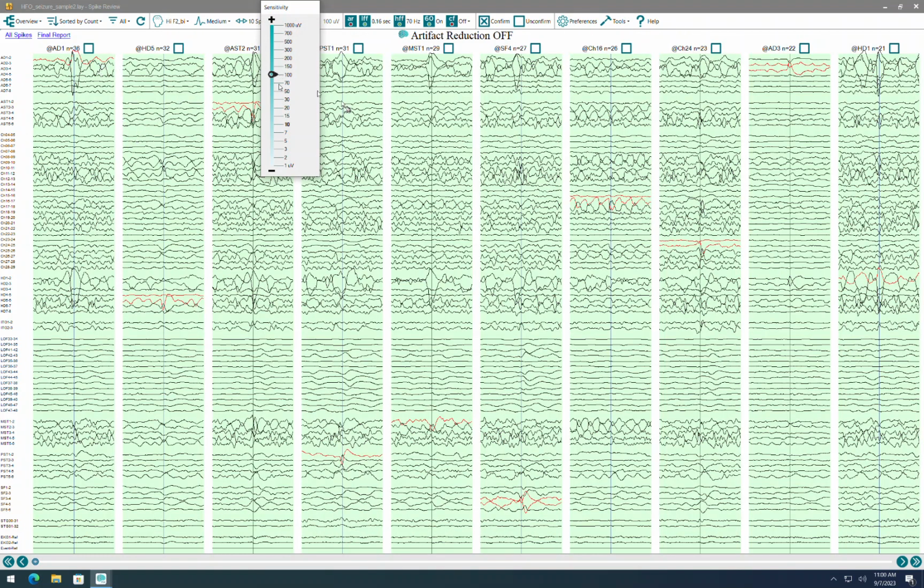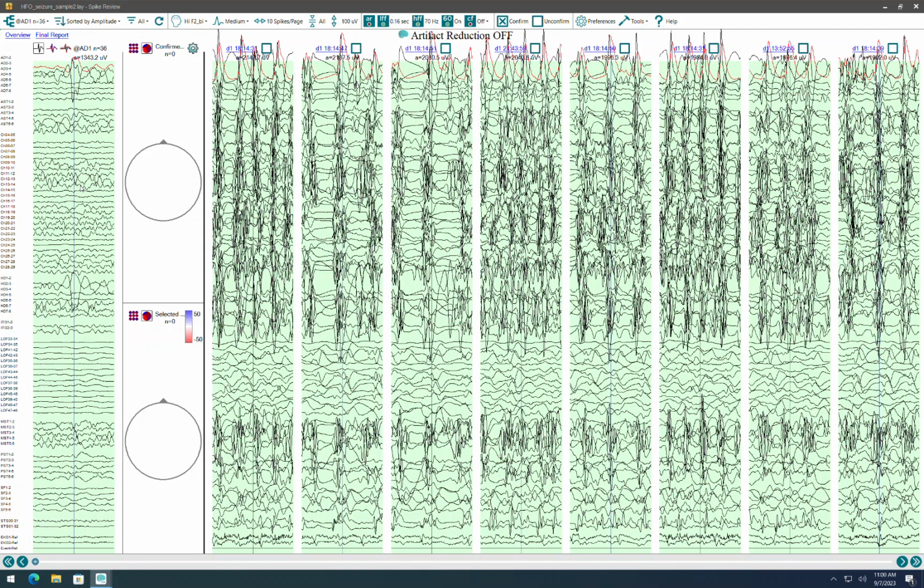And now we're showing, in whatever montage we want to show, the detections by electrode, which is whichever electrode had the highest probability, which tends to be amplitude related mostly, but not always. And each one of these is marked with a particular electrode as the one that had the highest probability of detection, because it detects across all groups.